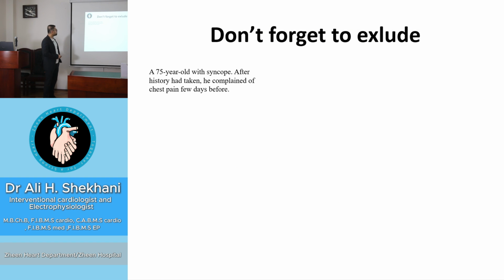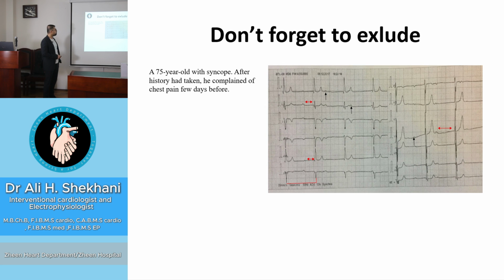And this patient, 75 years old, presented with syncope. And the patient complained of chest pain a few days before. Again, this patient has complete heart block, AV dissociation. When we received the patient, you can appreciate T inversion here in the inferior leads. So the patient has inferior ischemia complicated by complete heart block.